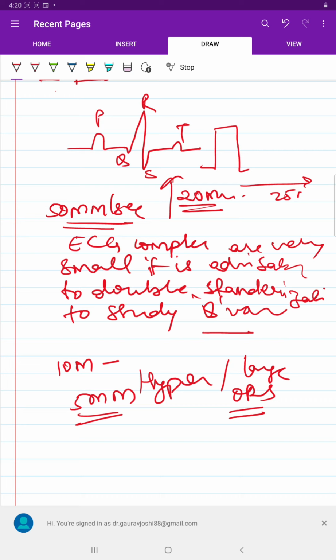So whenever you hold the ECG paper, first thing first, appreciate the squares, small square, large square. Another thing is to look for the standardization. The standardization is 10 mm and 25 mm per second speed. If you are comfortable with this, then we will move forward.